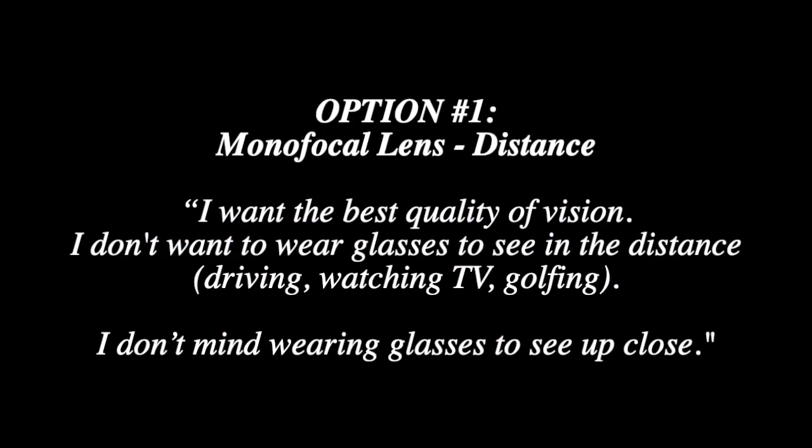Now this is option 1, the monofocal lens for the distance. This is the most common type of lens that is picked.